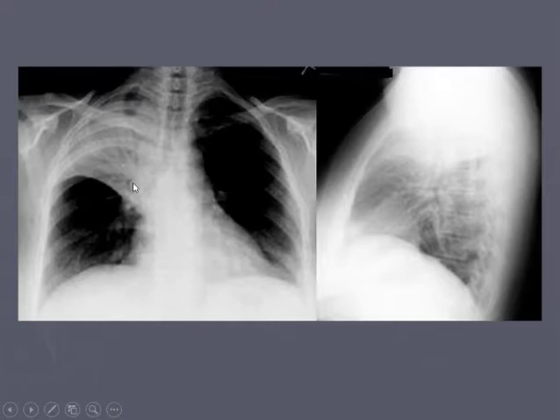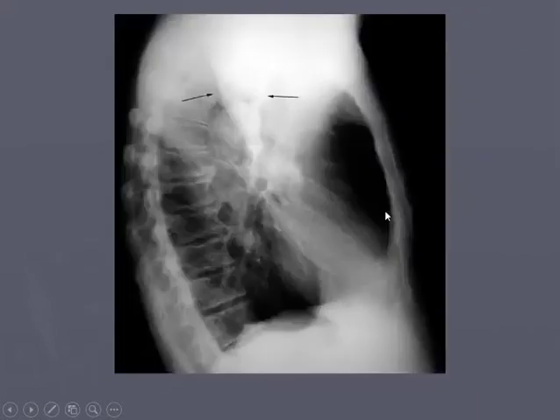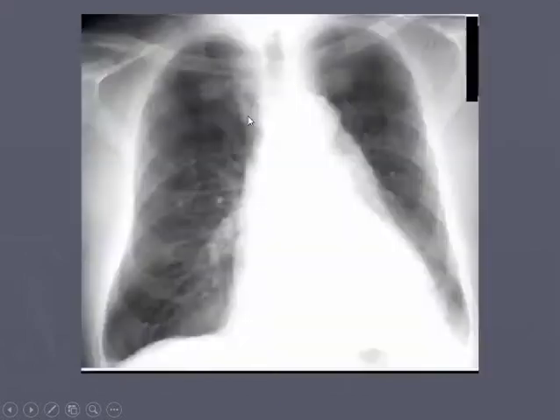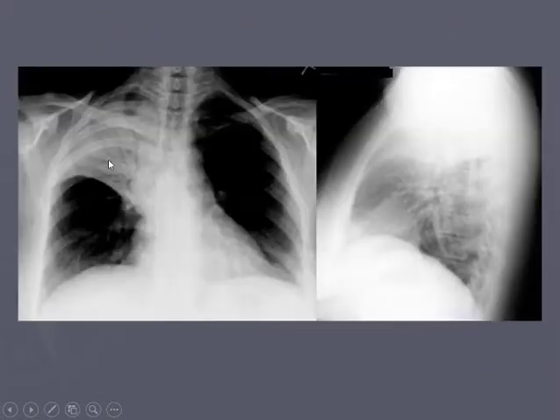So looking at this x-ray here, we can say, oh, well, how was that different from the atelectasis that we saw in the previous film? Remember, we saw that one earlier, several slides ago, that was very dense. It was right all up here. Let me go back to that slide real quick. There it is. So see this one, how dense that is, and that looks very similar to this one over here.